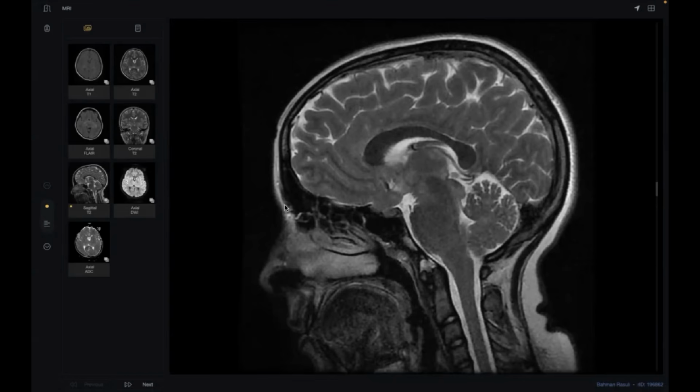What's your diagnosis? Sir, it could be due to any metabolic disorder.